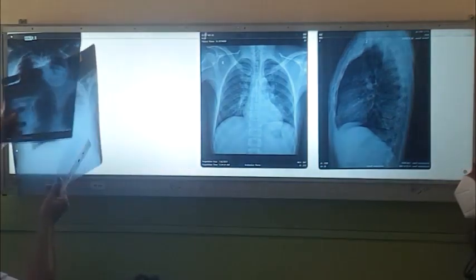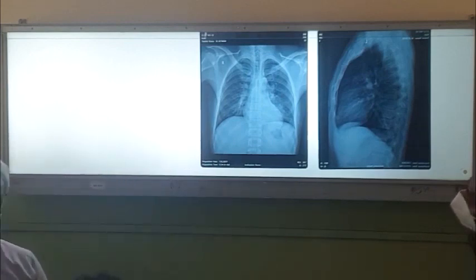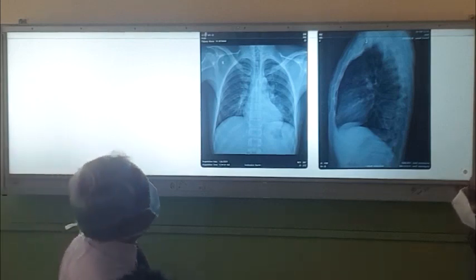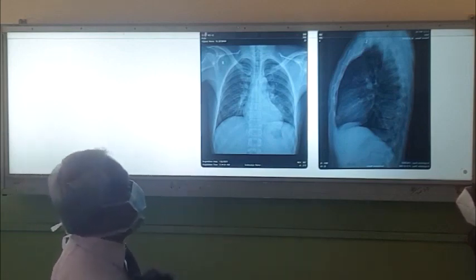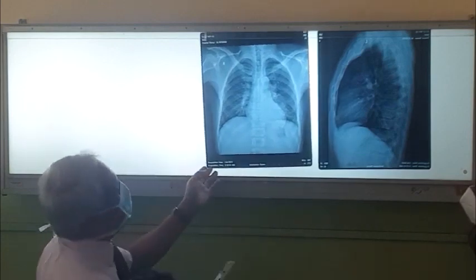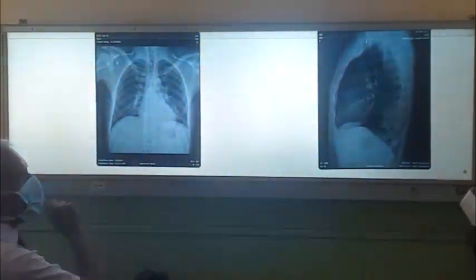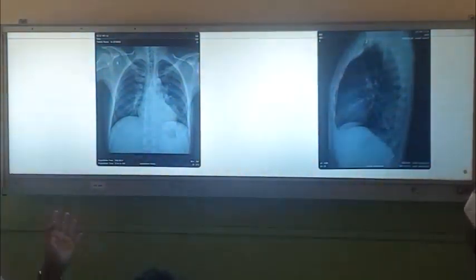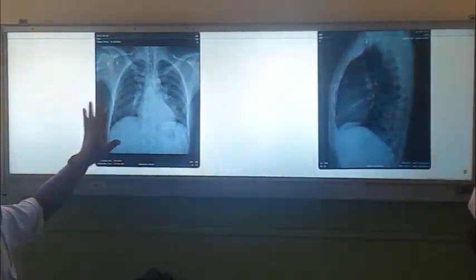This one is a young patient who came with left-sided chest pain and fever, suggestive of pneumonia. In this X-ray, I ask you to look for the descending aorta and the hemidiaphragm here. Hemidiaphragm you can see, but I can't see the descending aorta here. That is because next to the descending aorta there is opacity behind the heart, and you can see this left ventricular margin nicely. So nothing has happened to the left lingular lobe. Everything should be behind the heart in the lower lobe.